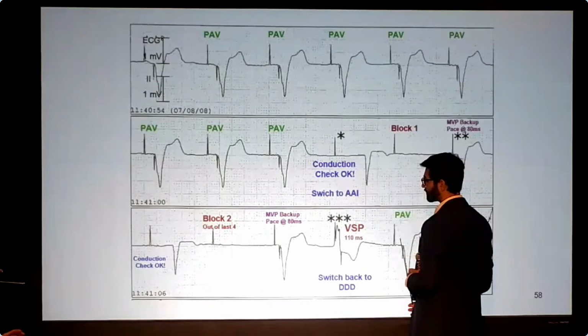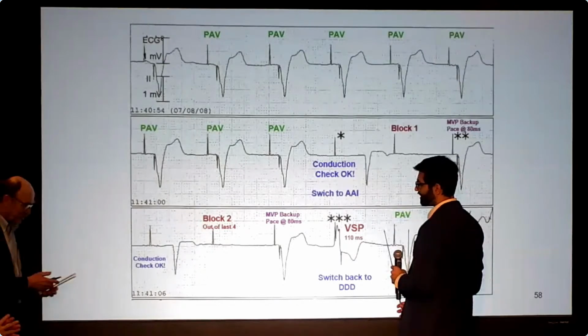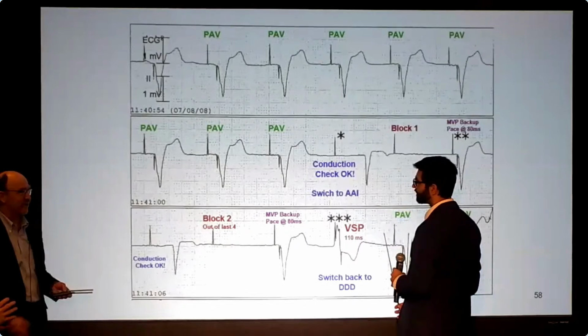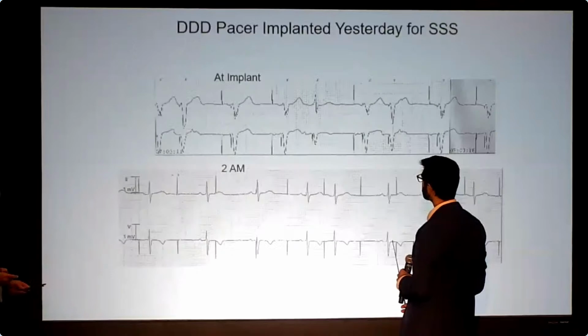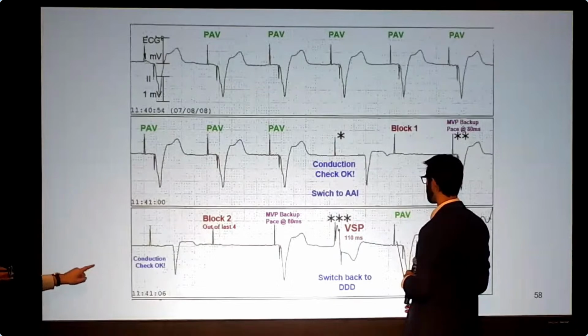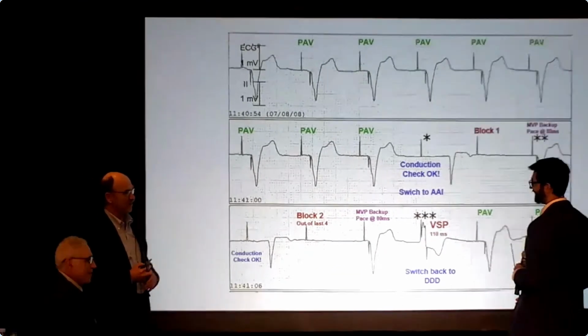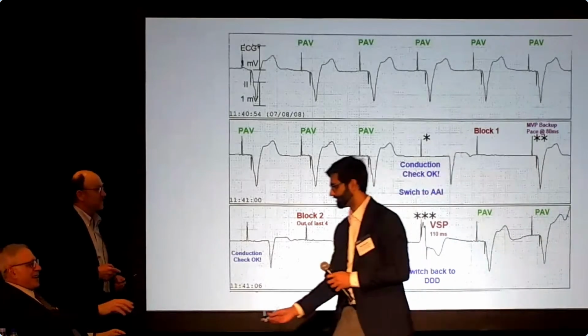Okay. And if that were true, he has the last word. Yeah, it's his slide. He gets the last word. Yeah, the patient was in sinus rhythm. Well, show me sinus rhythm. Look at all that junk. Okay, Kenny, go back. You can't just say no. Look at that. Show me a sinus beat. Show me one sinus P wave in there. Intracardiacs were good atrial electrograms. All right, you did a great job. I can't argue with that.